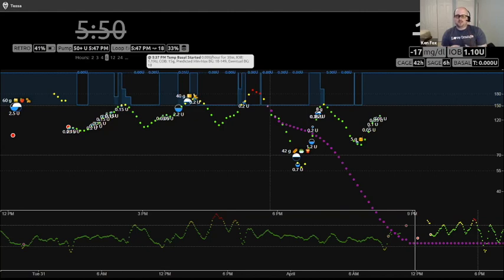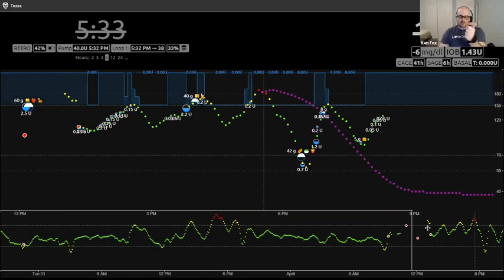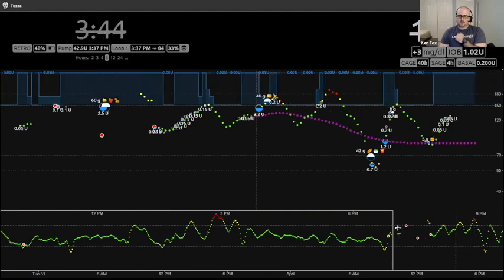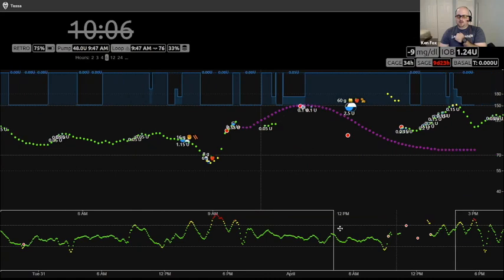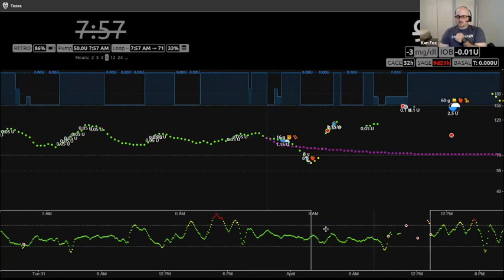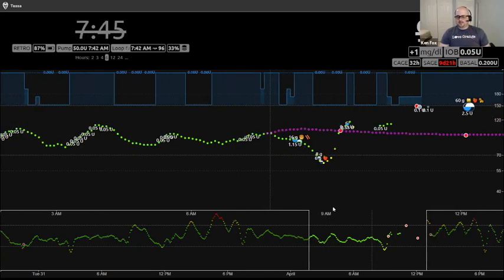So you can see the prediction change over time. Kenny, how do you scroll backwards? Yeah, so along the bottom here, you click and drag, or if you're on your phone, tap and drag. Just drag across with your finger, and you can scroll backwards. And you see this, I'll go back a little further here. It'll scroll backwards, and this little window at the bottom slides with you.